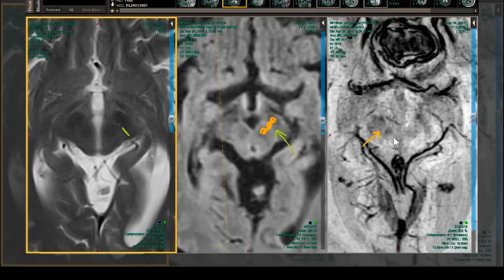But that can be a presentation of a dementia. They'll say, oh, Dad's slipping a little bit, and they have amyloid, but they just haven't had the hemorrhage yet. So what Dr. Pomerantz is pointing out is you could look at this gradient echo or SWI image and say, wait a second, there's a bunch of these little areas of susceptibility all over the place. This guy's got amyloid, and he may come in the ER next week with the hemorrhage, but when he does, everybody's going to know what's going on a little bit.